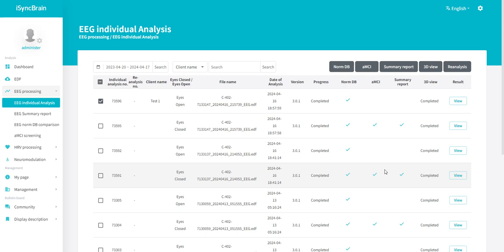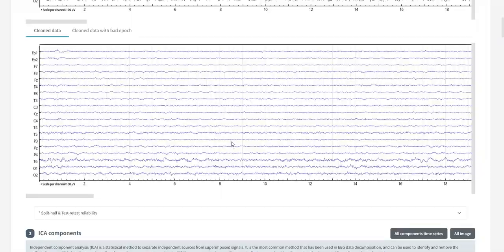This AI algorithm usually works very well, but occasionally it can make mistakes, so it's important for you to know how to go in and fix it when a mistake may happen. And that's what I will be showing you guys today. So for this example, we're going to be looking at this file.